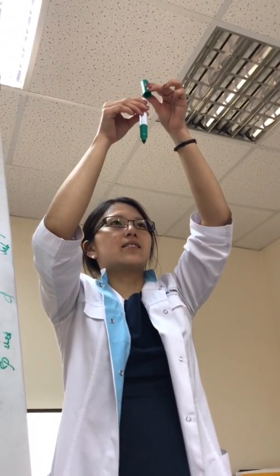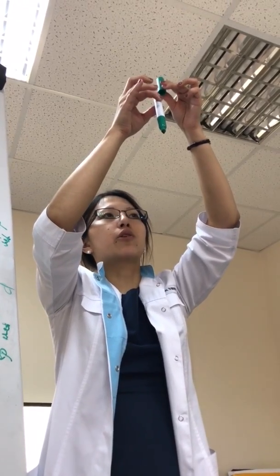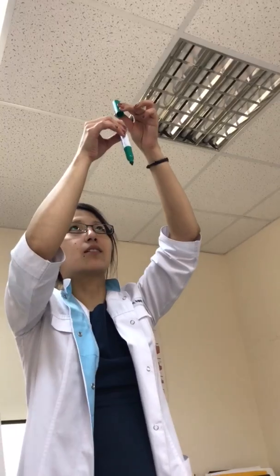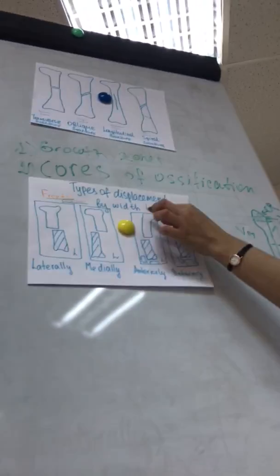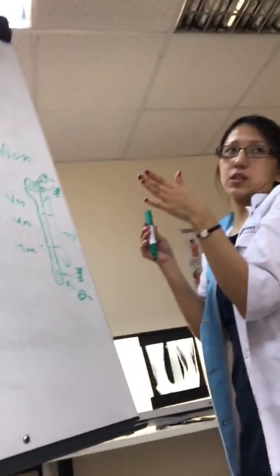Okay. This is a lower fragment. We should talk about displacement using this fragment. Where it goes, we now. If, for example, this fragment going here, by width medially. Here, by width laterally. Okay, about anterior and posterior, we should talk using a lateral position, okay?